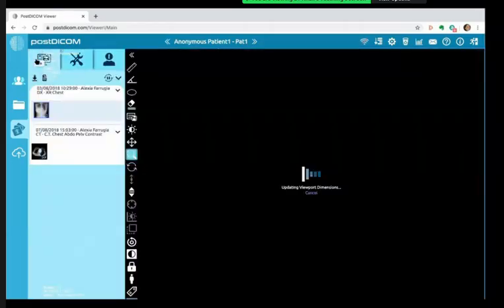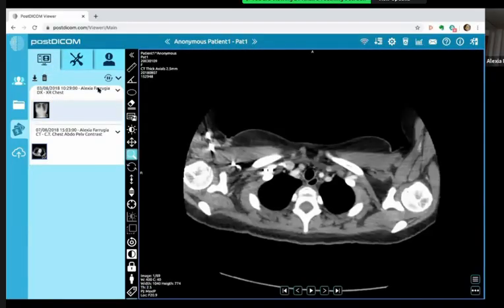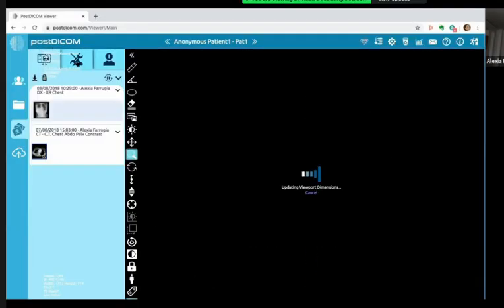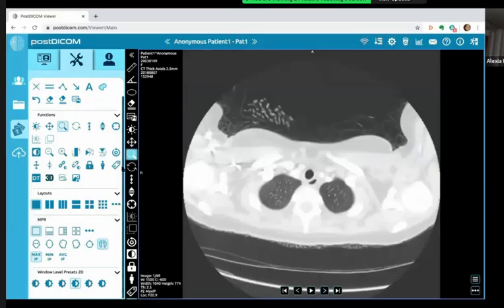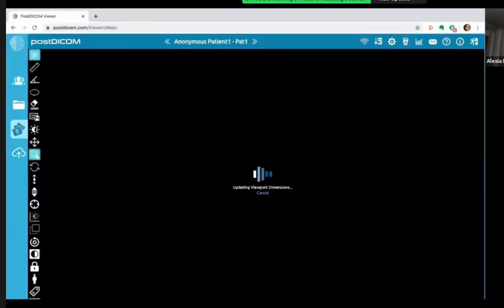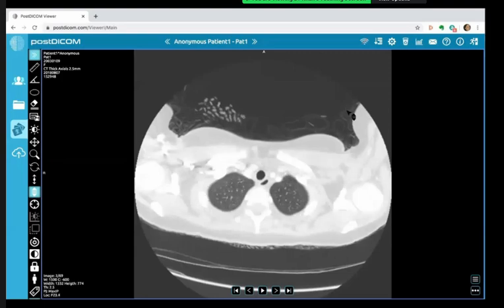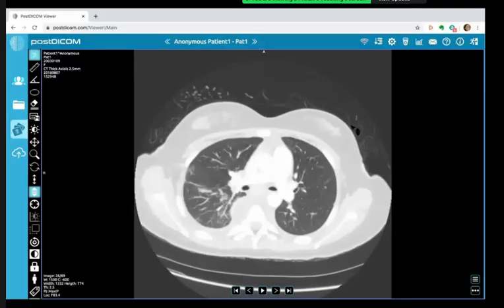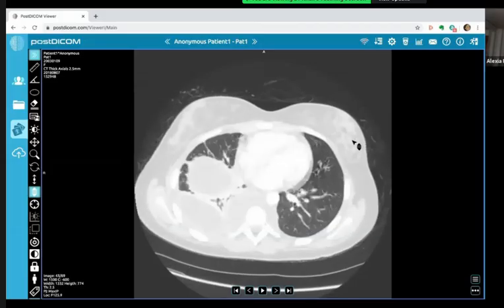She became increasingly septic, and a CT chest, abdomen, and pelvis was done to try and identify whether there's anything else. So in this scenario, one alternative diagnosis. I'm going to show you the lung window, and then I will show you the soft tissue window, and then you can tell me about it.